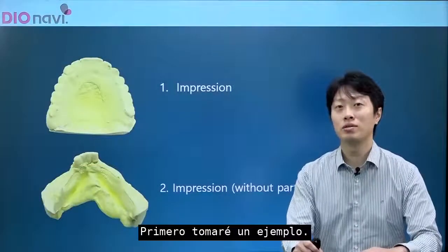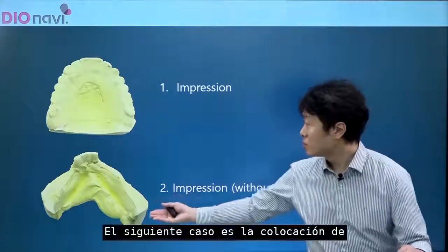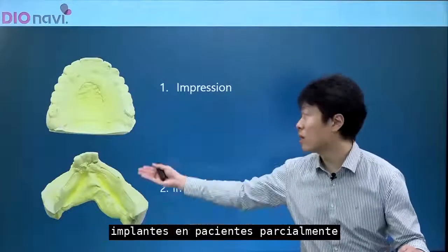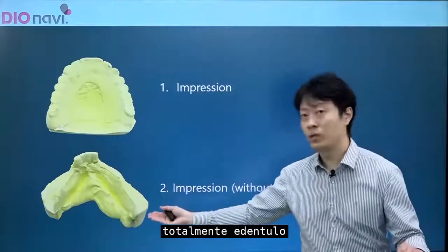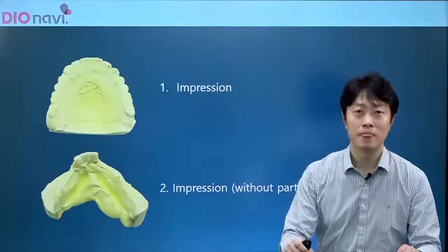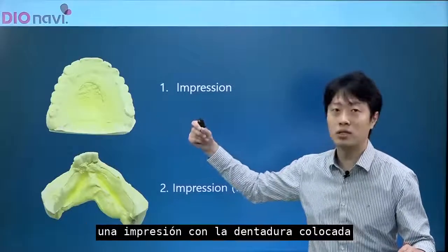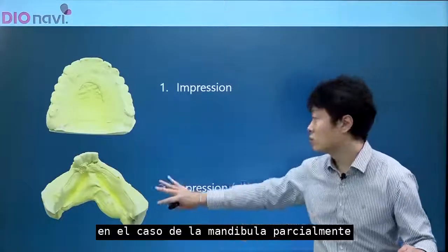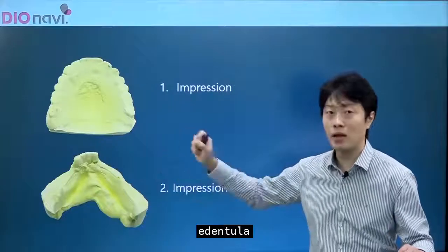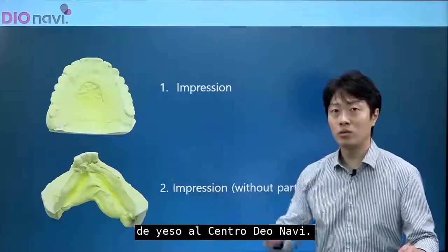I will first take an example. The next case is placing implants in patients with partially edentulous mandible and fully edentulous maxilla. In the case of an edentulous maxilla, acquire an impression with the denture placed. In the case of the partially edentulous mandible, acquire an impression and send the plaster model to the DIOnavi center.